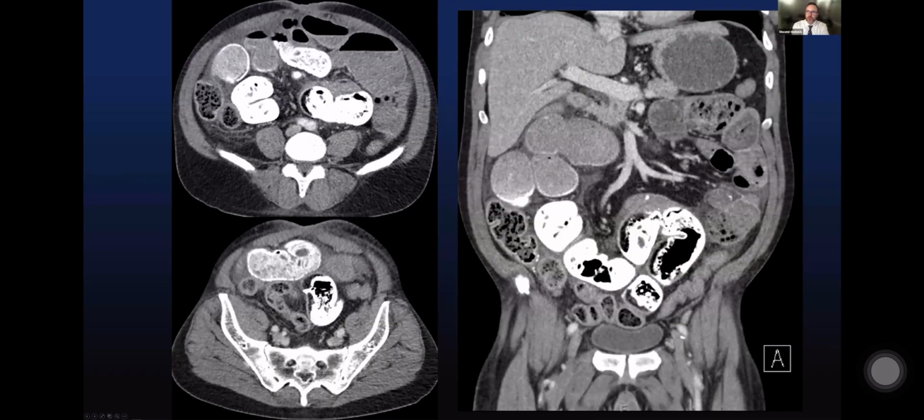Kind of a similar look here of someone with a small bowel obstruction, lots of mottled material in the small and large bowel. This person has a normal pancreas, though, does not have adhesive disease, really doesn't have an underlying cause for these findings, except for their medication history. Again, look at your patient's charts, look at their histories, and this person's chronic opioid use is the cause for this ileus of the small and large bowel with all of this pseudofeces everywhere.